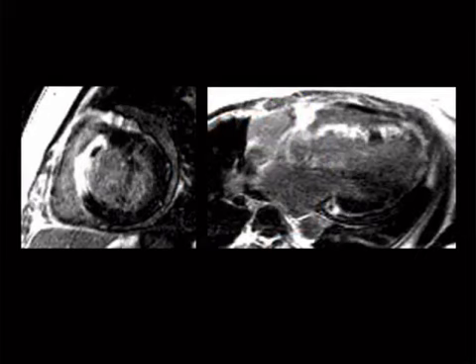Now what about this guy, the thing with the arrow on it there? What's that, and what does that mean? We see that this is an inversion sequence. We've got a short axis and a long axis here, and we're seeing that it's transmural, the whole way through, but then we've got this black island of stuff that's not enhancing. Well, what does that mean?